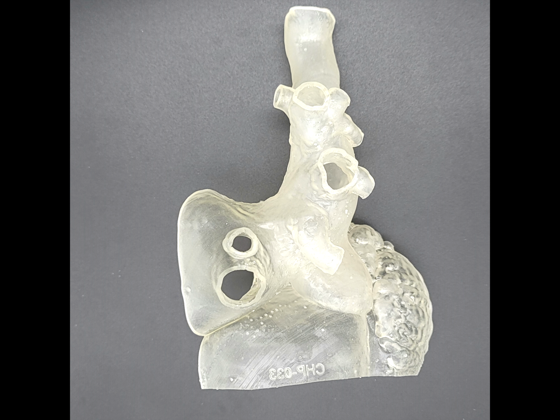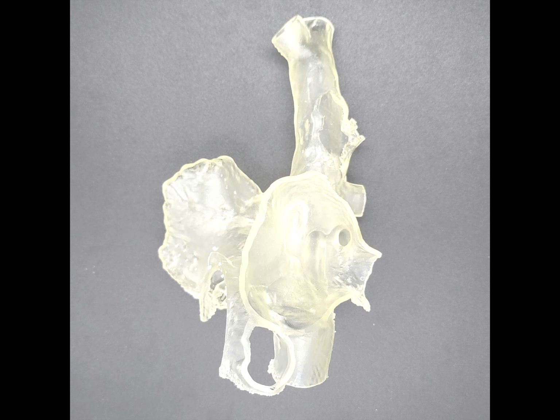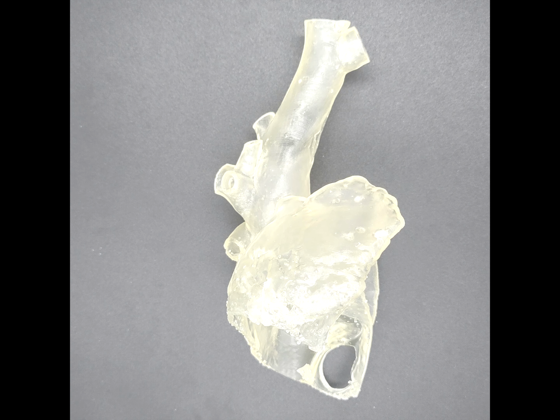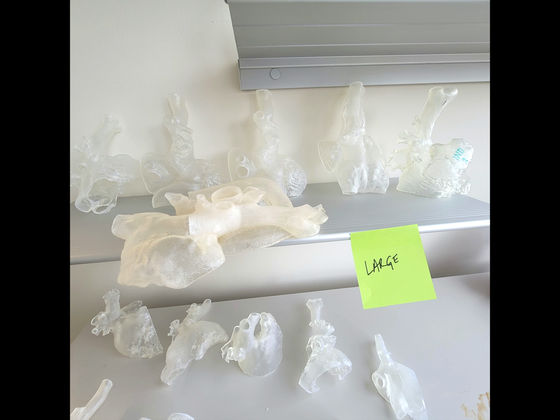3D printed models derived from CT or MRI images give much better insight into the anatomy and location of the pulmonary veins in relation to the superior vena cava. These images illustrate the drainage of pulmonary veins, change in caliber of the superior vena cava, as well as variation in the size of it in small, medium or large sized patients depending on the body surface area.